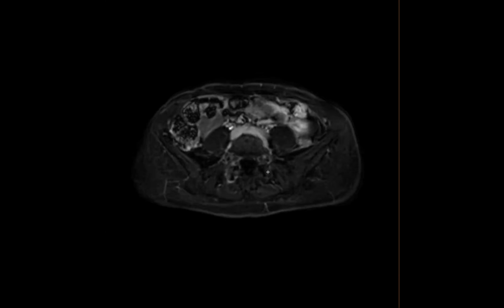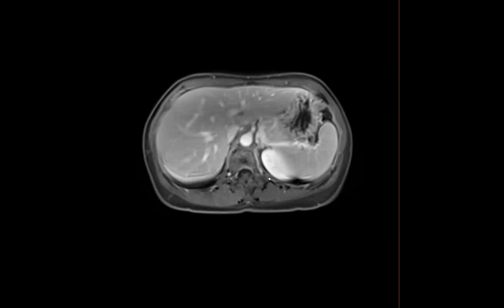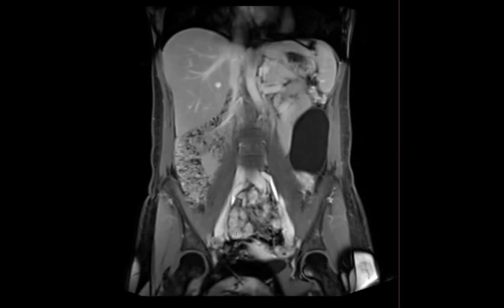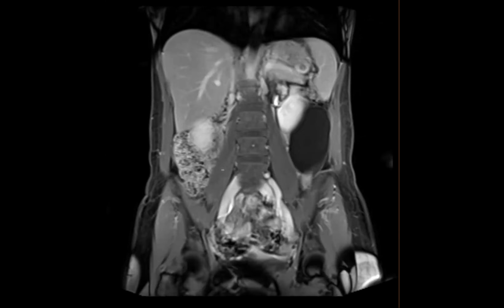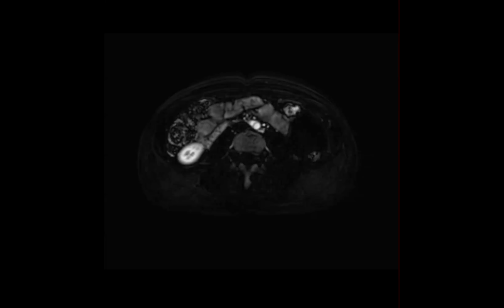Agree. It looks very simple, and I'm curious how you, in my mind, I think about a duplication cyst versus a lymphangioma. How do you say this is not a duplication cyst? That's a great thought. A duplication cyst will have a thick wall, and particularly when we do ultrasound, we see the gut signature. And yes, I agree, it's not lobulated, but because it's retroperitoneal, I would still think more in terms of lymphangioma. Yes, I agree, and those two make a difference.